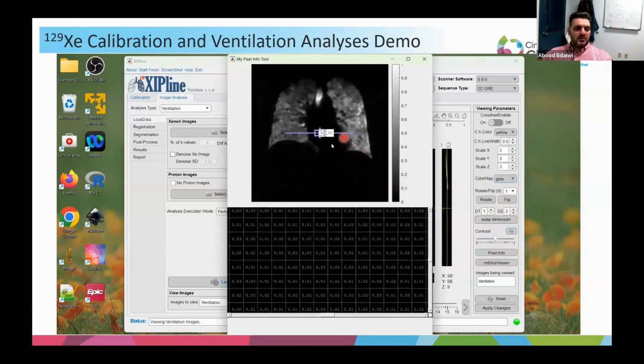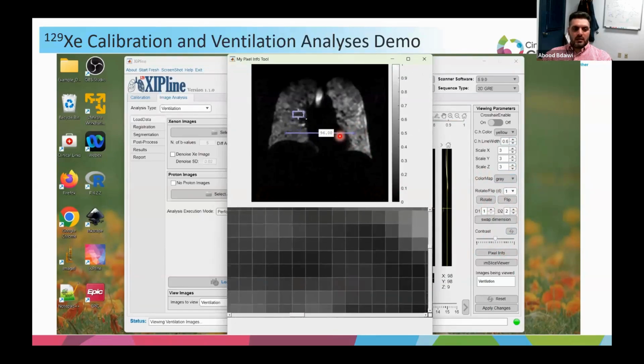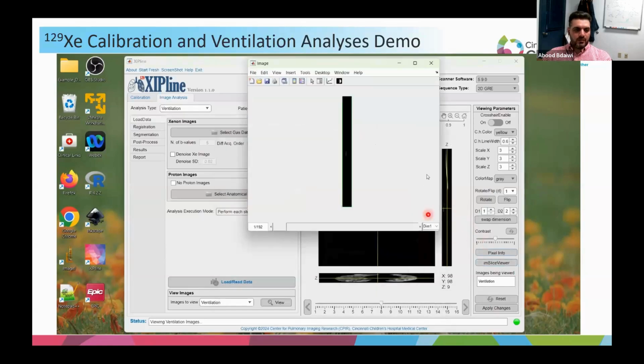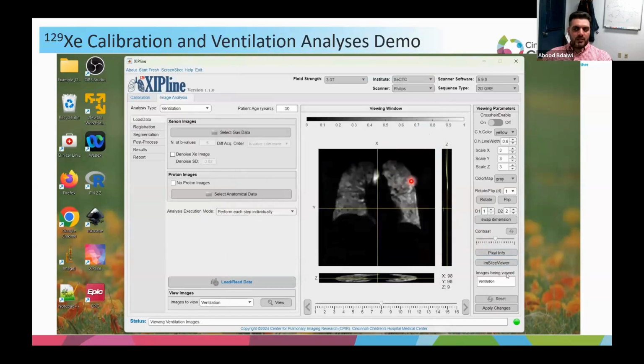And you can see here, there's just two tools here, the box, which you can drag around, and then increase or decrease. And then you can also do some pixel measurements here. We also have a 3D viewer, or I would say ND viewer. This is very useful when it comes to diffusion images, because we have a 4-dimension here.